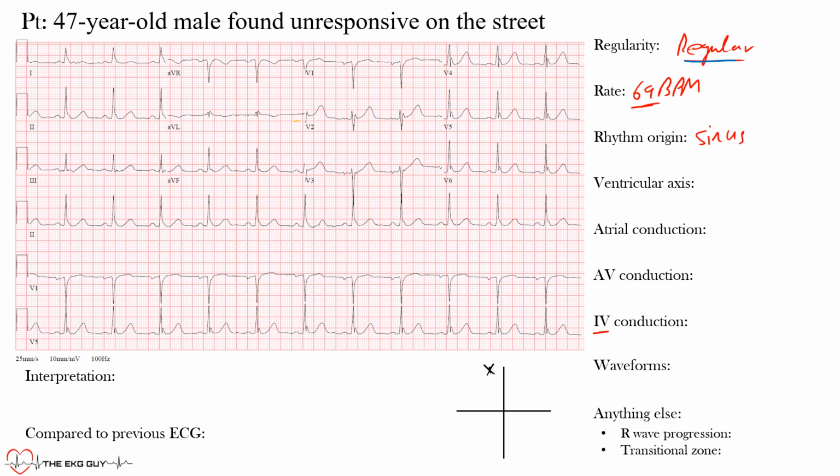All right, so let's find the ventricular axis here. For the ventricular axis, we're going to focus on the QRS complex, and we'll find the R axis, which is the QRS complexes. So we'll use the big complexes that represent ventricular depolarization. Now you have to know that normal ventricular axis is between negative 30 degrees and about positive 110 degrees. So all this is normal axis.